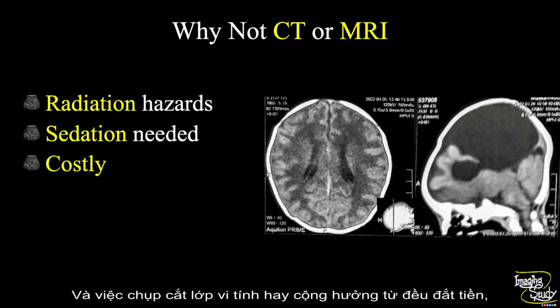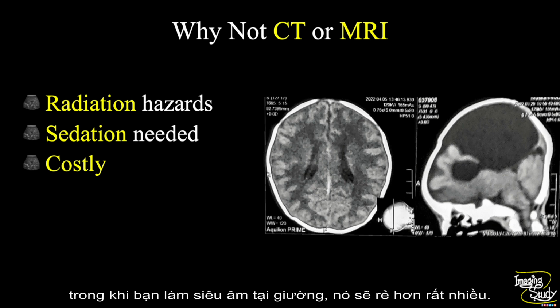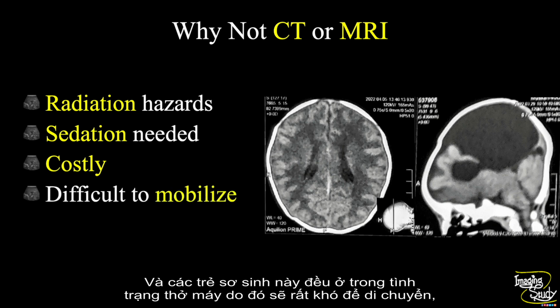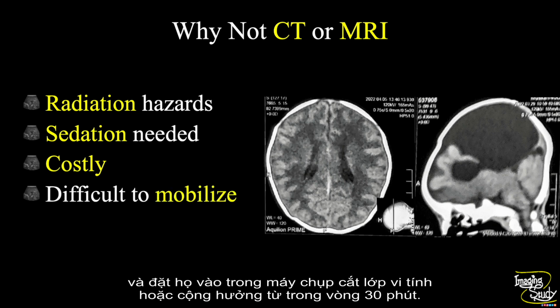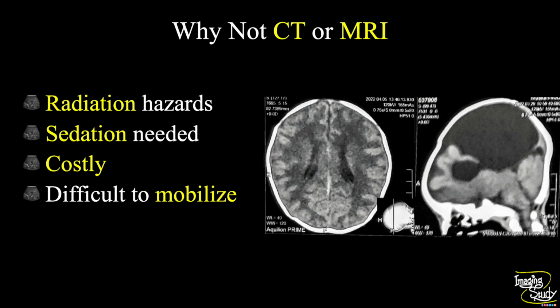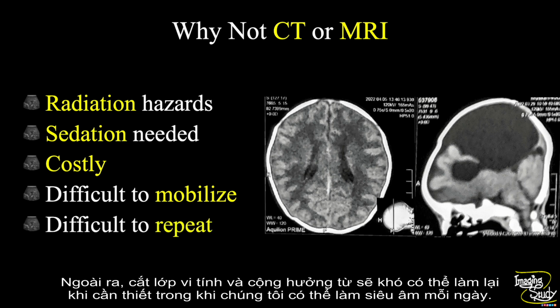Now these examinations are costly. When you are doing a bedside ultrasound, it is much cheaper than these investigation tools. And these neonates are on ventilation, so it's very difficult to mobilize them, and you can't take them off ventilation and put them into your CT or MR machine for 30 minutes. So these are very difficult processes for neonates admitted to the NICU. These are not procedures for repetition. We can do ultrasound every day, but not CT or MRI.